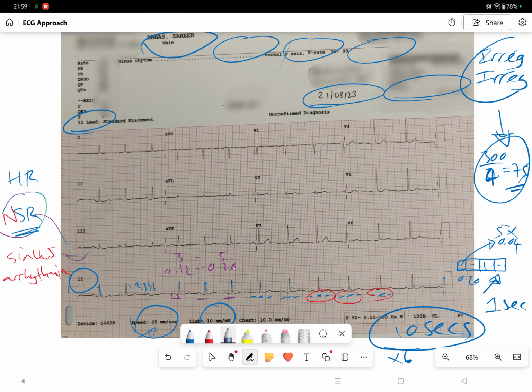In the given situation, we've absolutely got that, in that our PR interval is less than 0.20 seconds, so this is within normal range. If it was in excess, that would be prolongation of the PR interval, so what we call PR prolongation, indicative of AV block, which essentially is your first degree heart block.